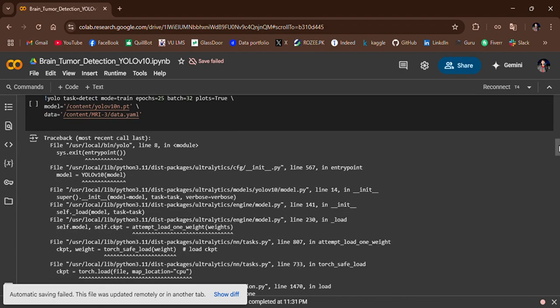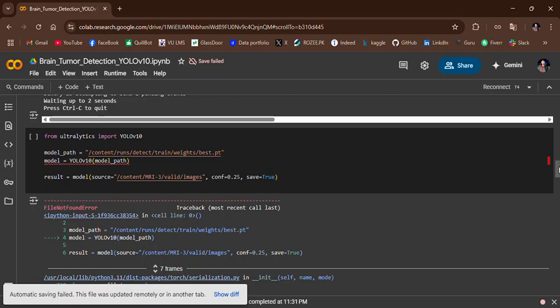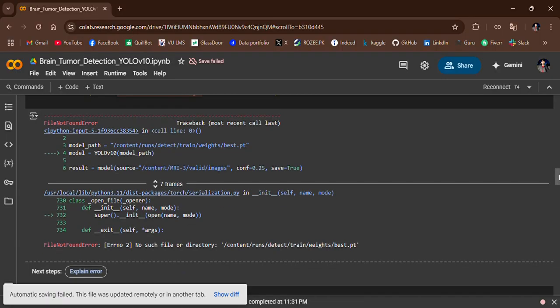Till now we have partial success, such as the dataset downloaded and partially trained, and images loaded and visualized using Matplotlib. Some prediction results were shown. We created an interactive Gradio app interface, though it may not have worked perfectly. We saw these errors, but we will solve them in the future.